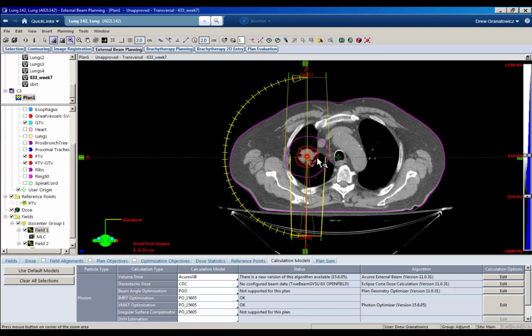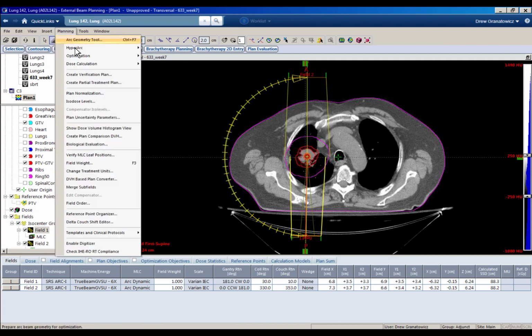Well, it's okay. Ideally, for SBRT, you want to use flattening filter free beam. It just makes sense. You want a hot spot in the middle essentially, or you don't care if there's a hot spot. So we don't need a flat beam profile. We can take that flattening filter out. It's just unnecessary, and without it, your dose rate can be a lot higher. So definitely, in the clinic, if you have FFF, you want to use it. For this case, I guess we need to use just standard 6x.